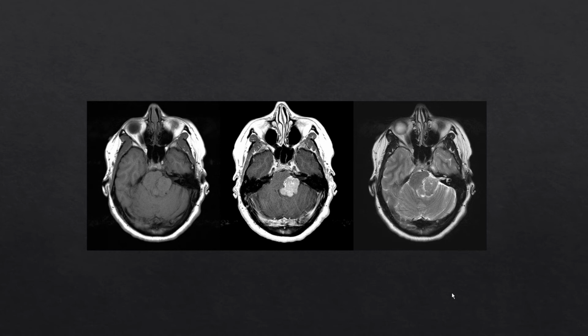This turns out to be a hemangiopericytoma. These can have a very similar appearance to meningiomas, and it's difficult to tell them apart, particularly because meningiomas are so much more common and can have a variable appearance. Things to know about hemangiopericytomas to differentiate them from meningiomas include lack of calcification. They tend to erode bone rather than cause hyperostosis, and they tend to have a narrow base of attachment to the dura rather than a broad base of attachment.